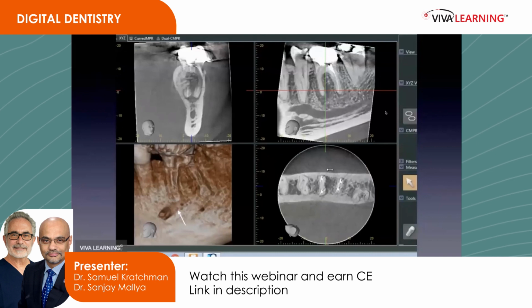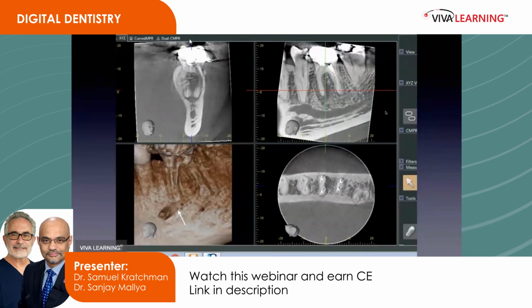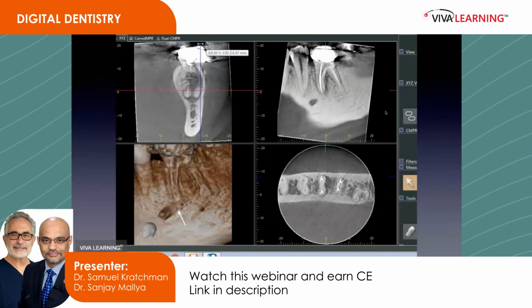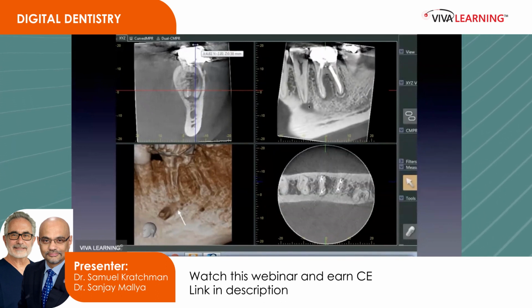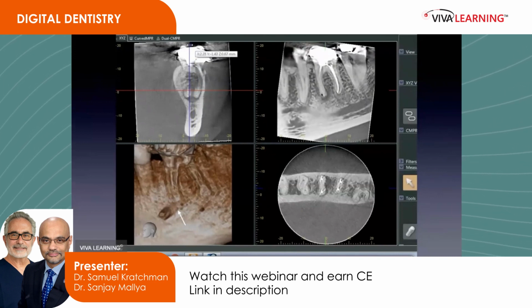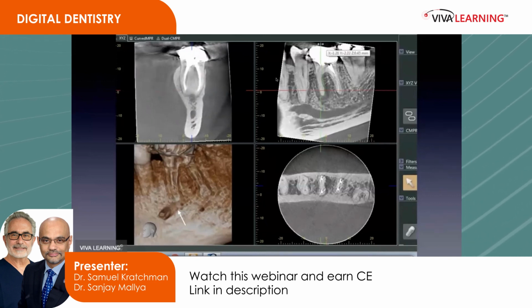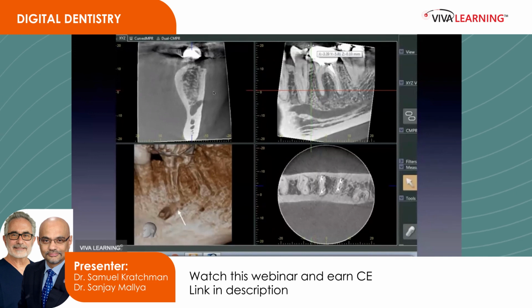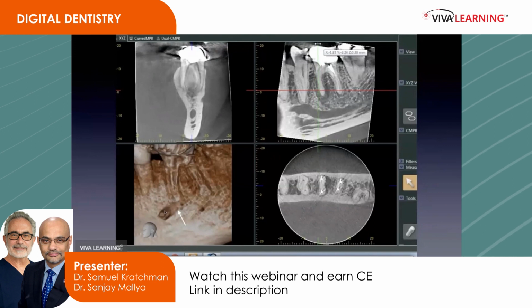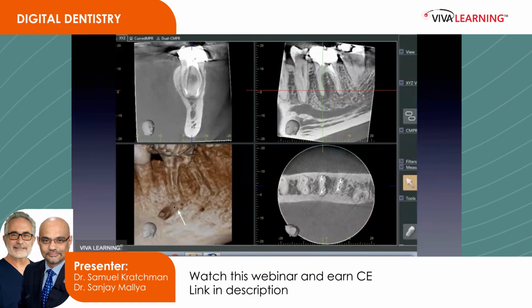But here's the importance. I'm about to show a video, and this is how I scroll through a cone beam. I'm not doing this now. This is how I do in my office, where as I move that blue line here, I'm looking here. And notice that the canal comes here, but then it circles back to the mesial root. And now as I'm scrolling here, looking right here on the cortical bone, that's where the entrance from the mental foramen is. So what's happening is the bundle is coming out through the mental foramen, circling right back to the base of that mesial root.